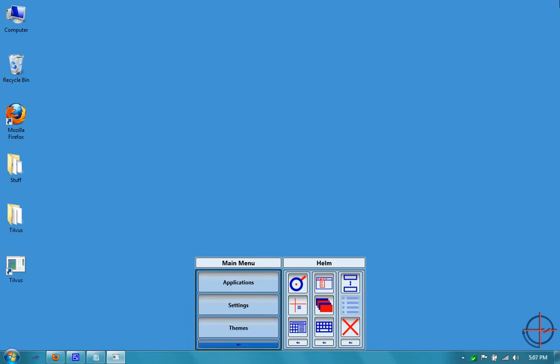Also, if you're stuck in any menu and you want to get out, it's easy enough to get out by clicking the double arrows. Those are usually found at the bottom or on the sides of a menu, and that helps you get back to the menu scanning option so you can readjust or select the feature that you're looking for.